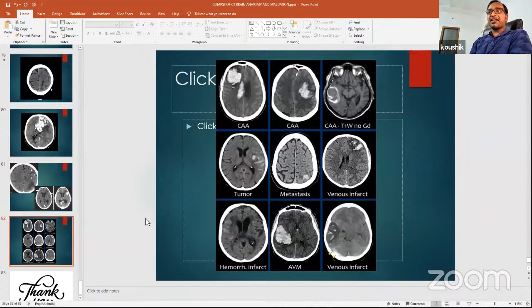That is one thing. Second thing is osteonecrosis and fungal osteomyelitis, mucormycosis, seen in a patient who complained of headache in the maxillary and frontal region, and CT found fungal osteomyelitis. That is the second thing. Rather than venous sinus thrombosis, studies say there are even parenchymal hemorrhages, but not that common.